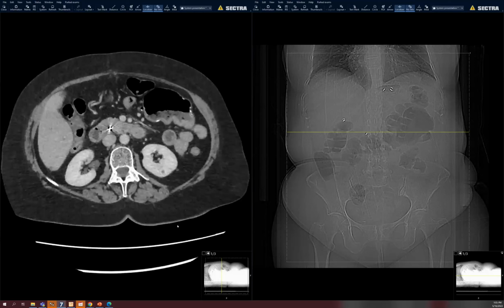If it's a vasculopathic patient, it could just be ischemia to the cystic duct, or there's some reports which said if there's excessive motion of the abdominal wall in a certain direction, that can predispose to cystic duct stump necrosis, and then clips just migrate. So just a cool scout case and a pitfall on MR.